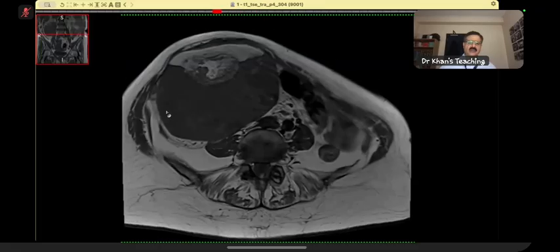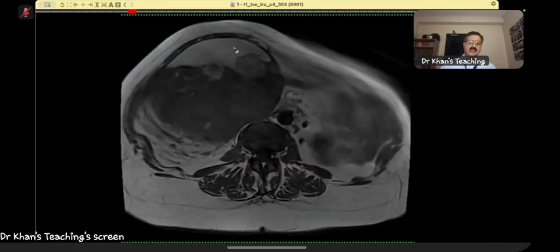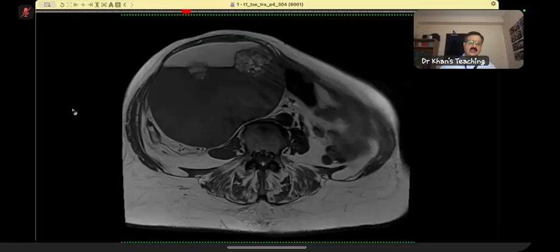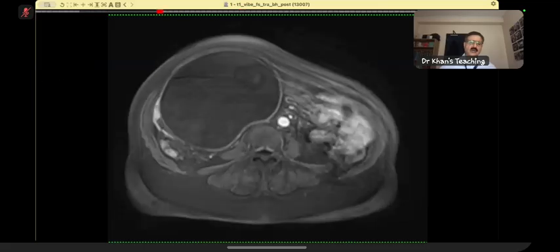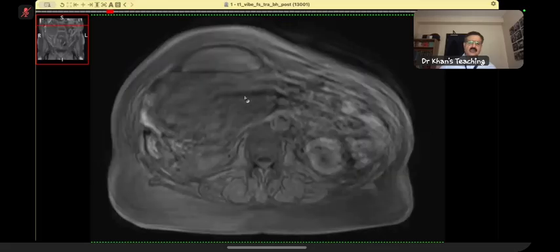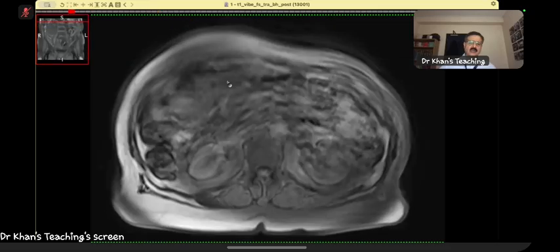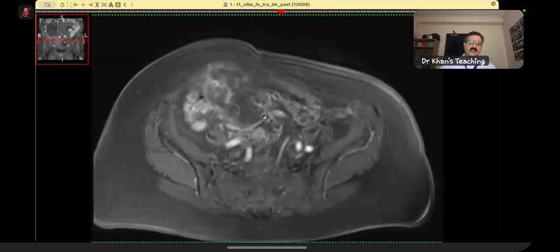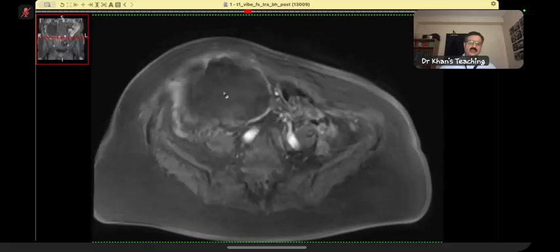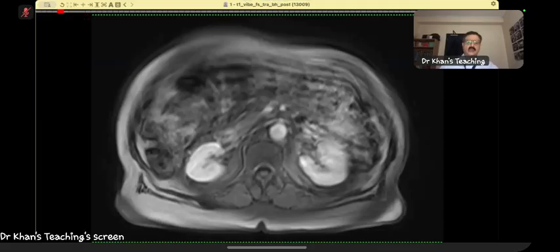Sorry, this one I had shown you already. So this is a T1 weighted non-fat saturated, and you can see that these components which are bright became low signal, and this one did not become low signal. Now on a post-contrast sequence, of course, you should ask for a pre-contrast fat saturated. This is what it was just before contrast was given. Everything becomes dark, so the extracellular fat has also become dark. On the post-contrast sequence, we can see this ugly area shows some necrosis, some enhancement, and this is the fatty part. So this is an immature teratoma with metastasis.